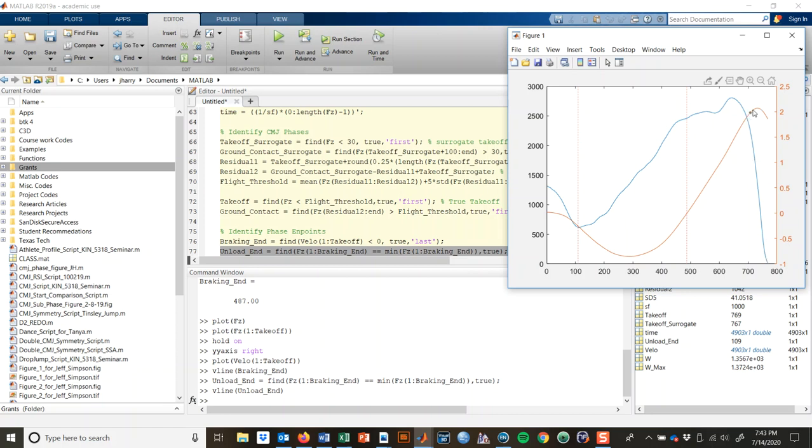Now there are periods of time because if you look down here, you see we've got increasing velocity, decreasing velocity. So you can actually break that up into other phases based on acceleration or deceleration while moving upward, but I think that's a little bit beyond the point, because how much can a jumper actually apply into the ground during that deceleration period? I think not much. Why you decelerate is because you can no longer extend the joints. So it's not necessarily a phase that we can manipulate as a jumper. It's kind of a functional limitation.